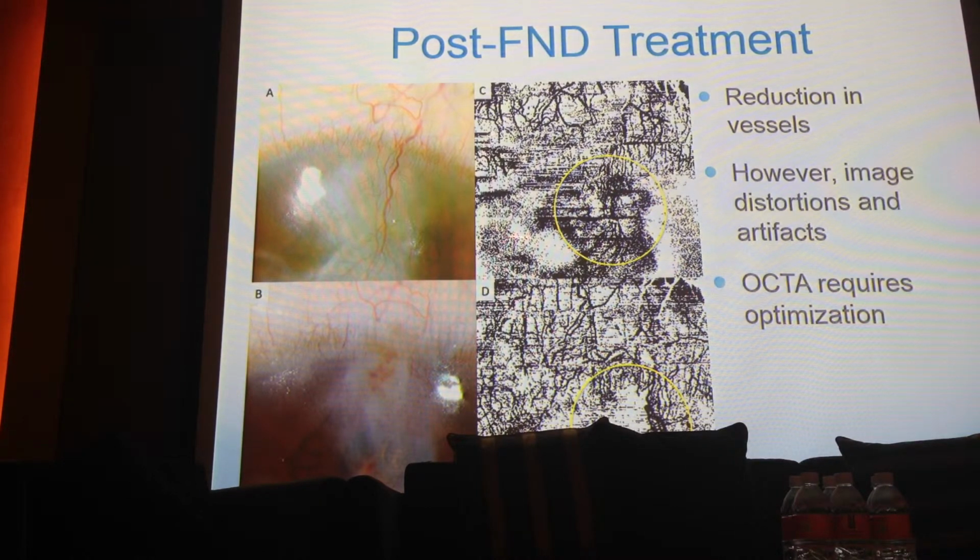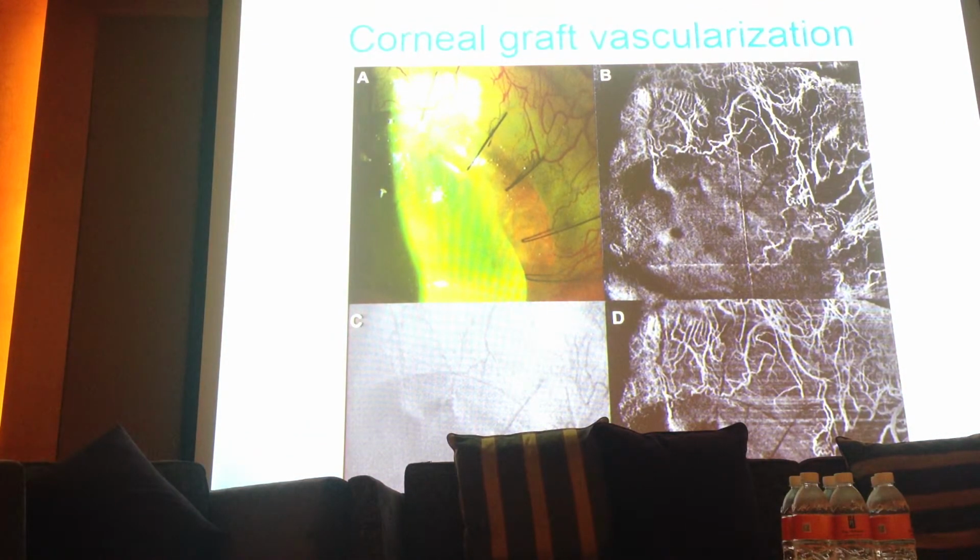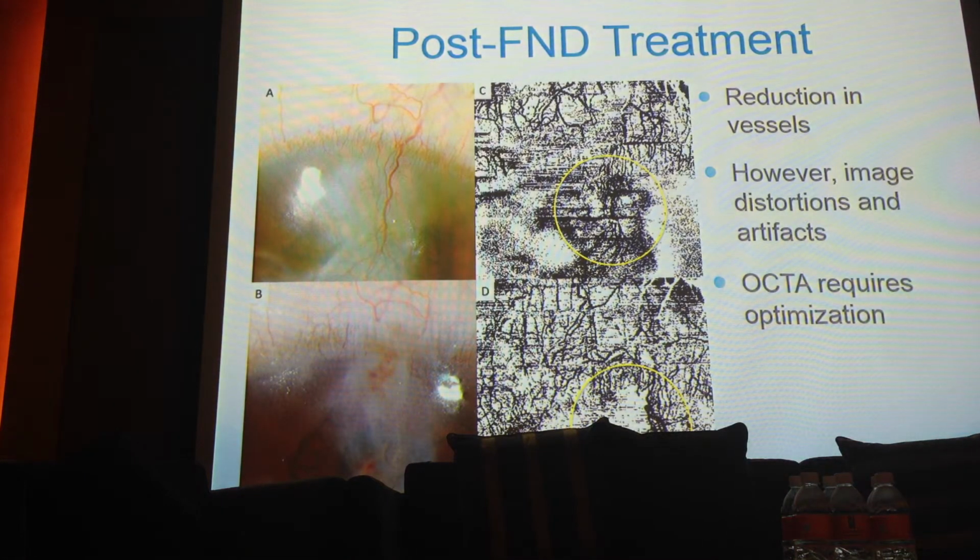So this is motion artifact. This is very hard to get rid of, right? But not the best images. Can I ask a question about that one? So if you think it's axial movement, right? Clinically, does a vessel have that kind of force, or is it hard? I tried to look at it. It's not something that's coming towards you directly, but it changes direction, not in this plane. It sort of comes from deep and then superficial.